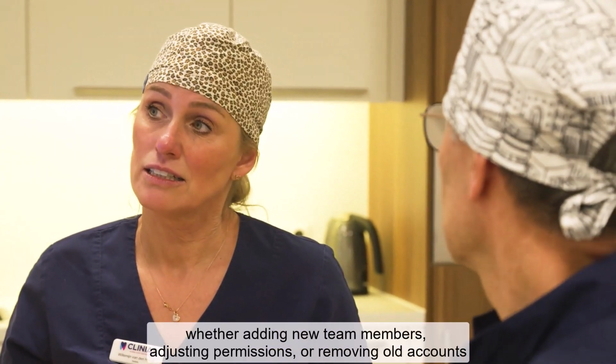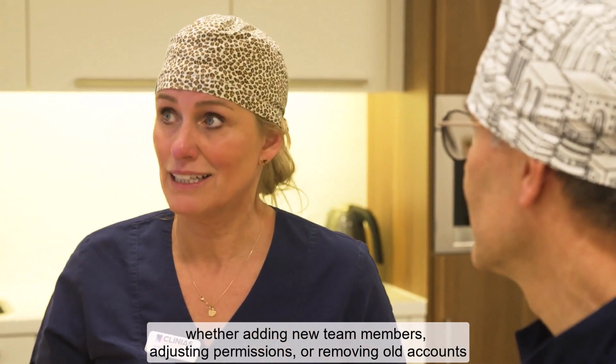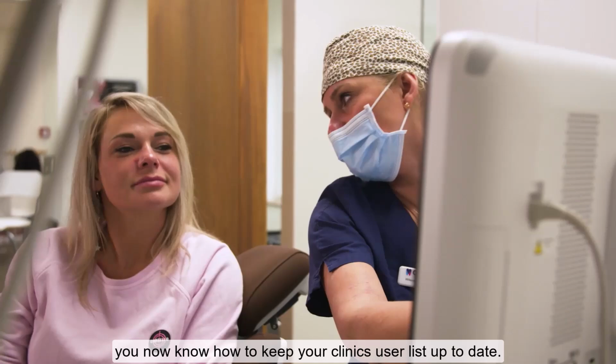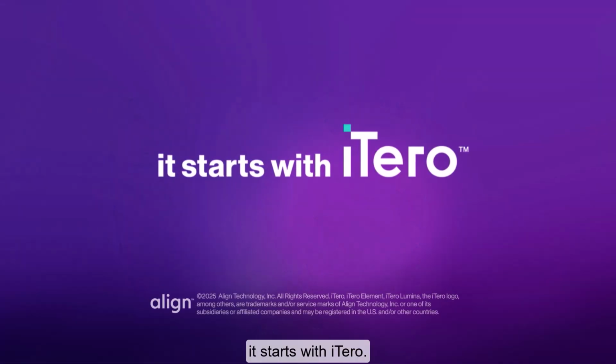That's it. Whether adding new team members, adjusting permissions, or removing old accounts, you now know how to keep your clinic's user list up to date. It starts with iTero.